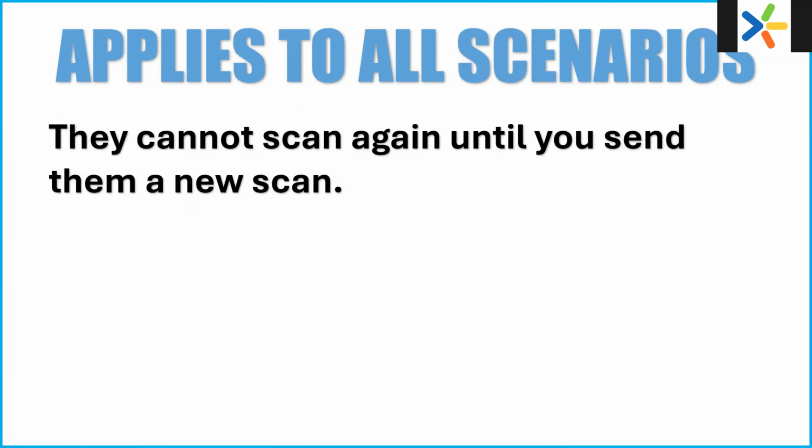If somebody clicks on your remote sign up link and they create a profile and they download the app and run the scan, if they click on the remote sign up link again and put their email address in, it'll say, hey, you already have a profile. Contact the person you're working with so they can then send you a new scan. So that's what will happen. But let me go ahead and visually show you what they'll see if they try to run a scan again without you sending them a new one.